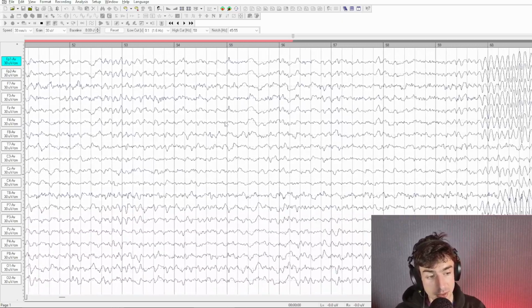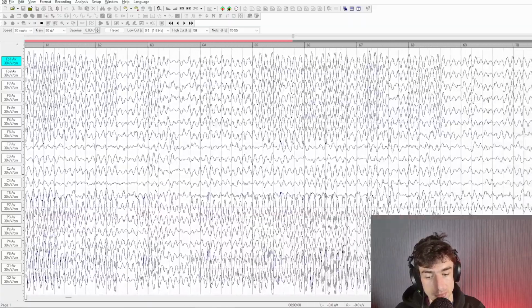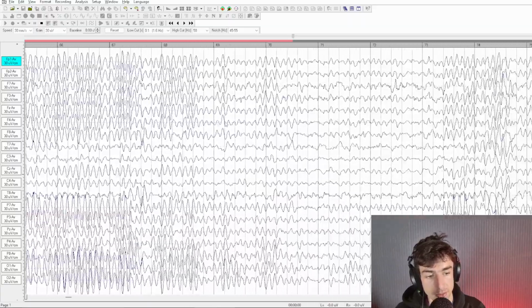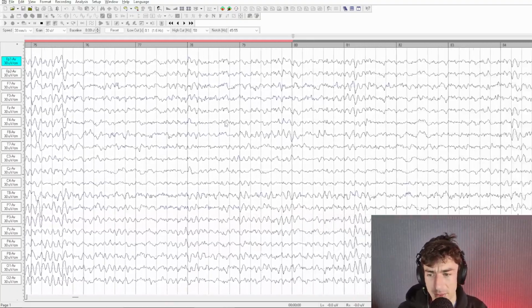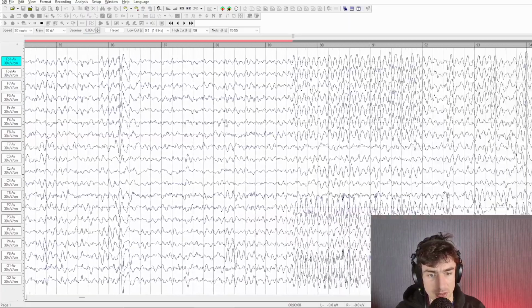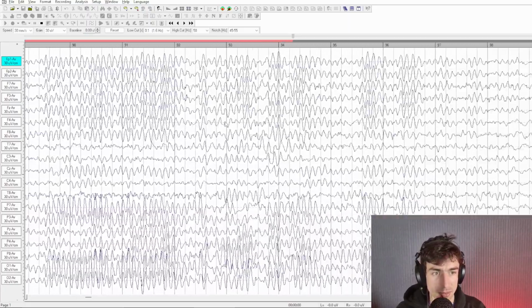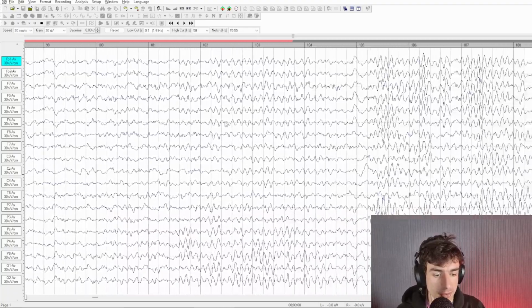It's a relatively clean recording. And yeah, a little bit of lateral eye movement potentially, looking at F7, T8 there for a moment. But in general, we're not seeing a ton of artifacts so far.